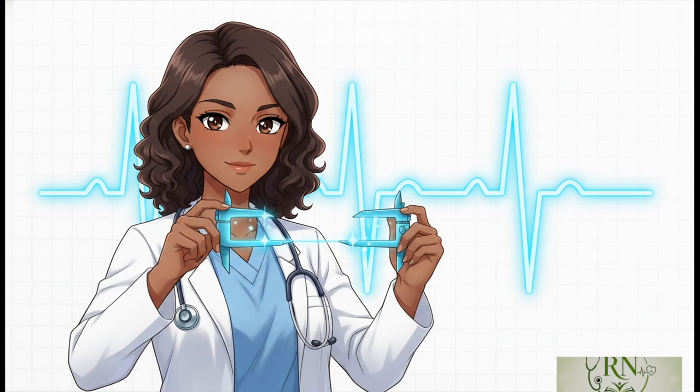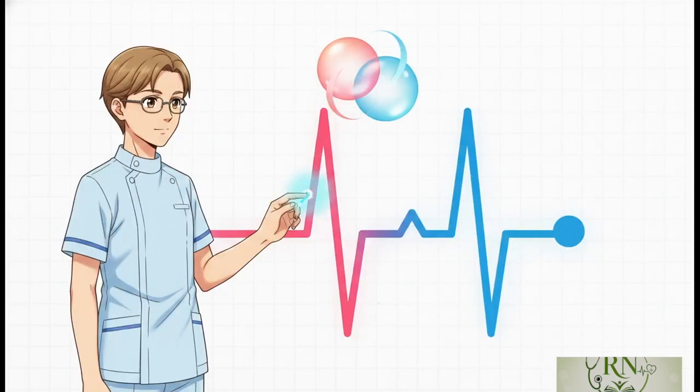So we've got matching rates, perfectly regular rhythms. We are setting a really strong baseline for a healthy heart here. Okay. Now for what is always my absolute favorite part of the analysis, the P waves. This tells us what is actually kicking off the heartbeat.